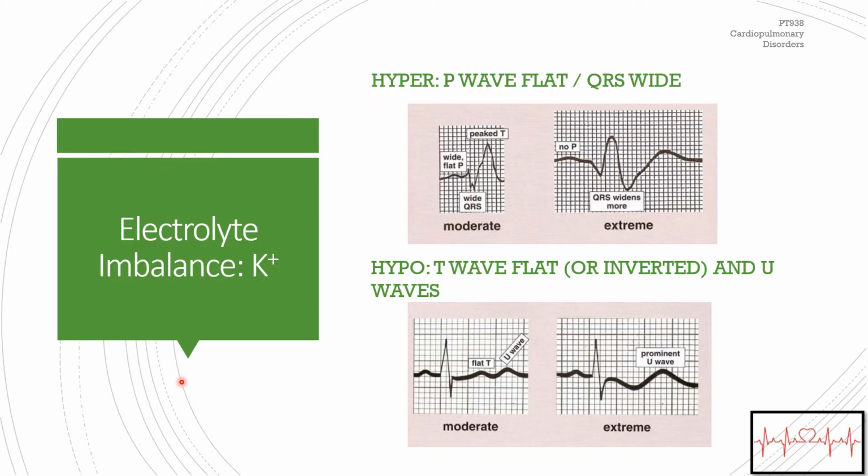All right, changing gears one more time. We're almost there, guys. Back in pathophysiology, you learned about lab values. You wrote about how they affected a client, what they indicated, what PT should be aware of, and what precautions to take. So we're going to look at 2 of those electrolyte imbalances that can lead to significant changes in heart rhythm, and how to recognize those on an EKG.